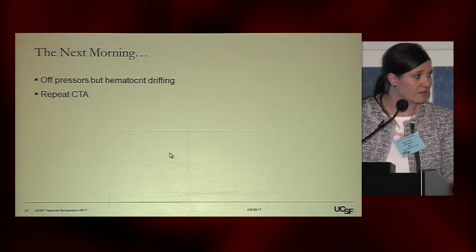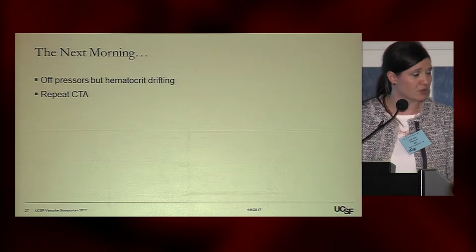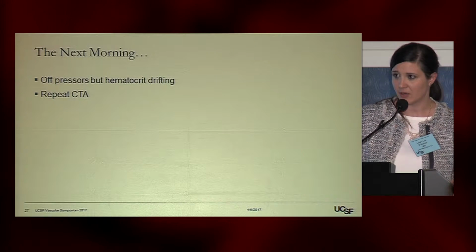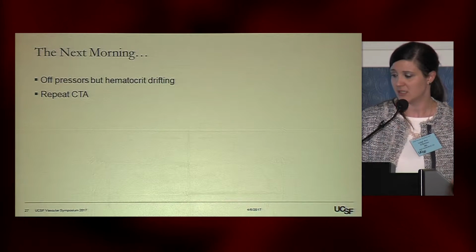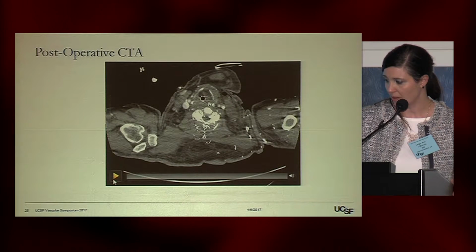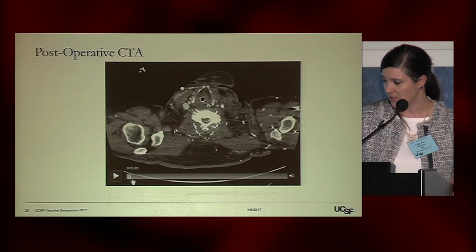He was actually off all of his pressors. His blood pressure recovered nicely. But then the next morning, we noticed a significant drop in his hematocrit, which prompted us to repeat a CT scan, out of concern that something wasn't quite right. And so this is the CT scan.